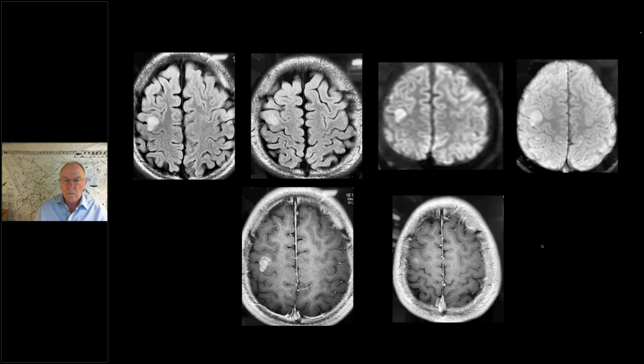Do you see diffusion restriction in them? No, not commonly. Right. What about tuberculoma and neurocysticercosis, all of this? But it's the same over the last 12 months, so I would have thought they would have regressed or some changes would have appeared over the serial images. Okay. Because with a single scan, I would have thought of infective or inflammatory etiology.